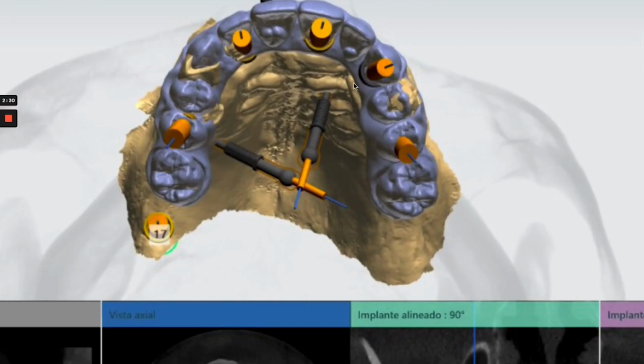The doctor used the 3Shape surgical planning, and by superimposing these files, he was able to also add the CT scan and then treatment plan the position of the implants based on the design that he created in the Smilefy software, facilitating the procedure and the steps to deliver a more harmonious and clean surgical execution of the treatment.